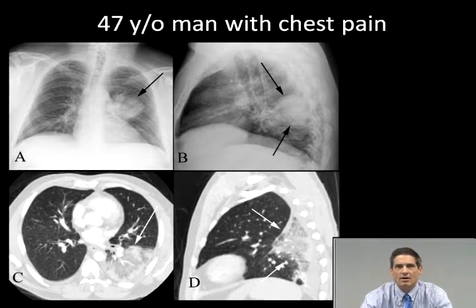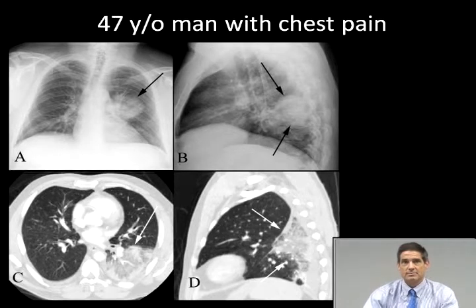So these are some of the other causes of chest pain. You might also see things like painful arteriovenous malformations, painful pneumonia, aortic dissection, esophageal rupture. Sometimes the diseases have abnormalities on chest X-rays that aren't specific and you need a CT. Sometimes even the CT doesn't help you entirely.